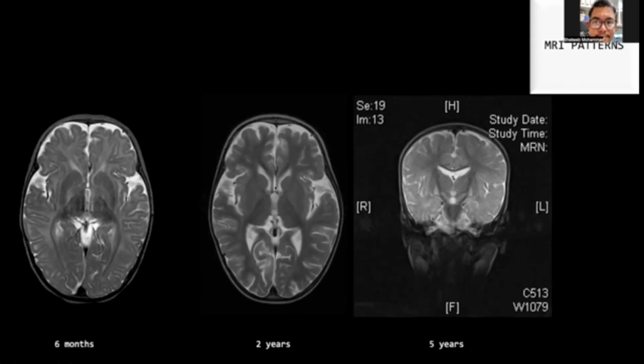It is more difficult to appreciate any abnormality at 2 years of age, when the globus pallidus is transforming from being bright, as you see in infancy on the left scan, to gradually becoming iso-intense before it becomes hypo-intense compared to the putamen and caudate as we all grow older and the globus pallidus accumulates iron. This is an important age to be careful in either under or overcalling MRI changes in the globus pallidus. So this patient had kernicterus.